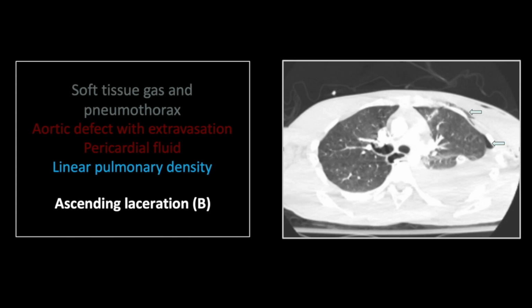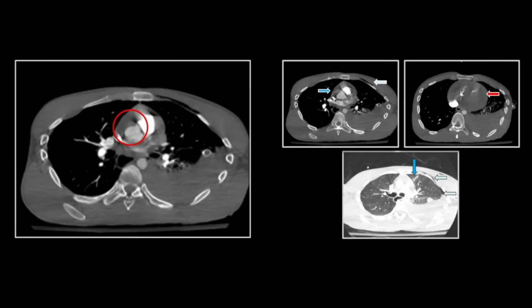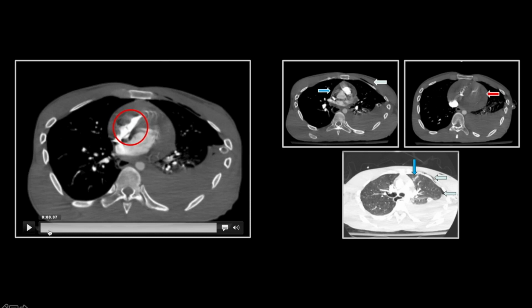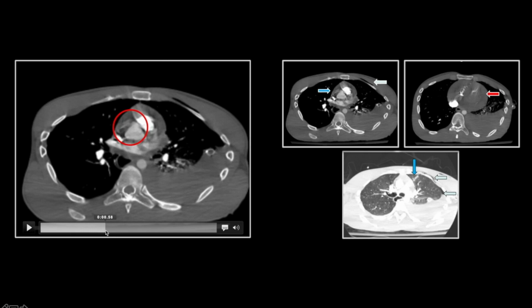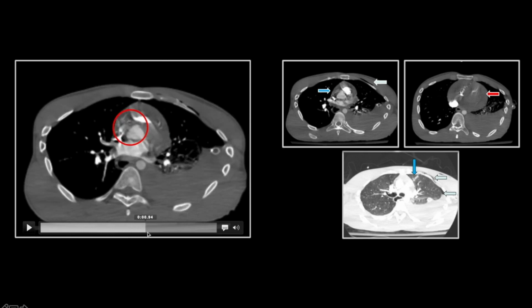On lung windows, there is extrathoracic gas and a small hemopneumothorax, but also note this linear tract left by the stabbing. It is an important principle in penetrating trauma that you not simply lay a ruler along the path of penetrating trauma and expect all injuries to be restricted to that path. This particular case is an excellent example of that. Again, you see the ascending aortic defect right there on the anterior wall and really quite distant from the path suggested by the stab wound.